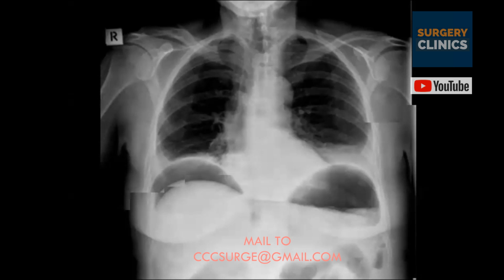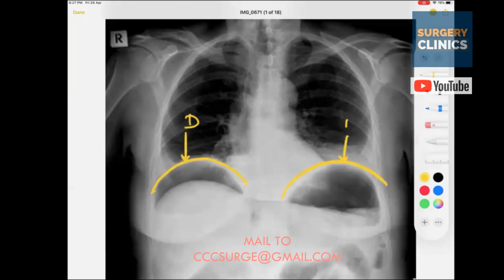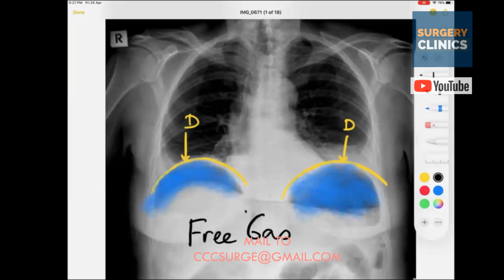This image that you can see is an airway, breathing, circulation, ABCDE. Now the A is air, the B is bones. Now, can you notice that there is something wrong in this picture? And this one is all about the D thing. So if this is the diaphragm, the D, what is so special about the diaphragm? I taught you this one. So this kind of air below the diaphragm is called free gas or free air, you may say gas, under the diaphragm. And believe me, it is the most common MBBS X-ray.